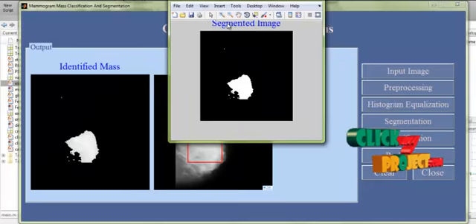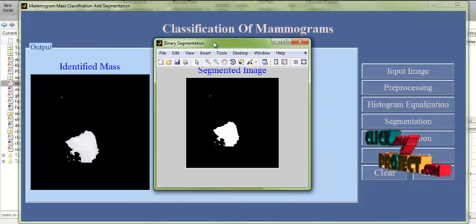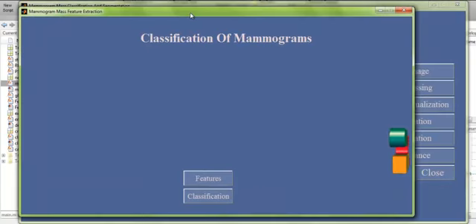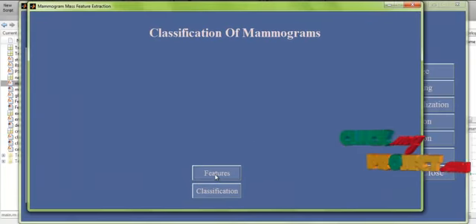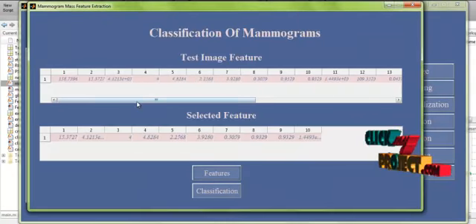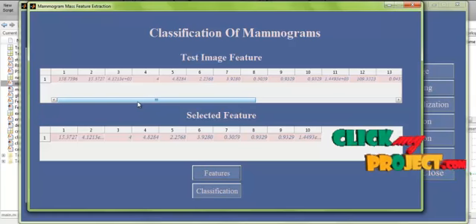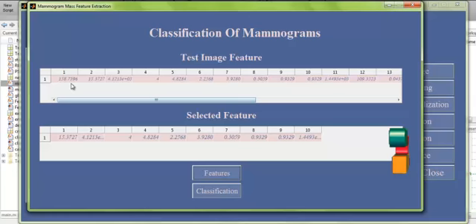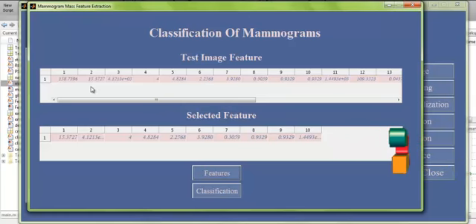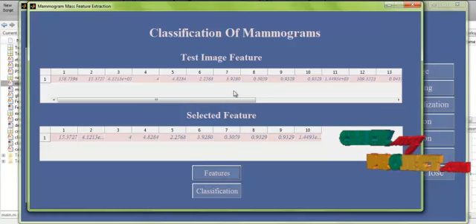After that the segmentation is employed based on the region growing segmentation. So as we can see, the binarized regions and the identified mass regions were denoted, and after that the classification is employed. Before classification we extract features from the images. In addition to the GLCM features, the perimeter, area, and the height and width of the overall mammogram segmented regions were collected, and also the mean, standard deviation and variances of the segmented regions were measured. So these are all extracted as the features.